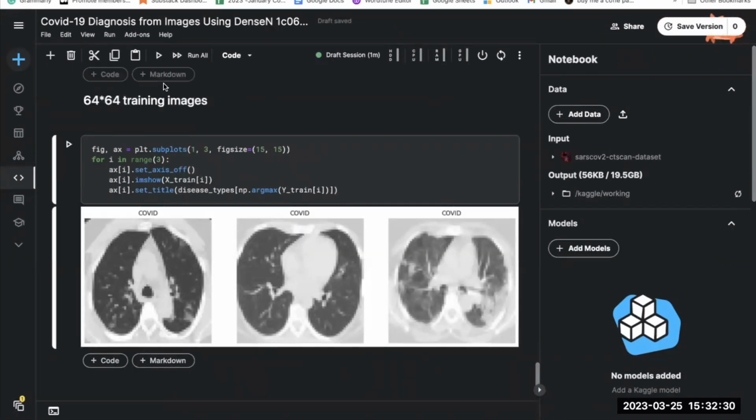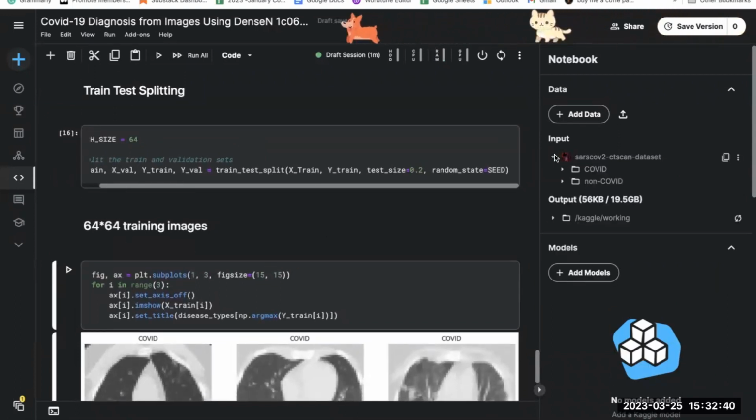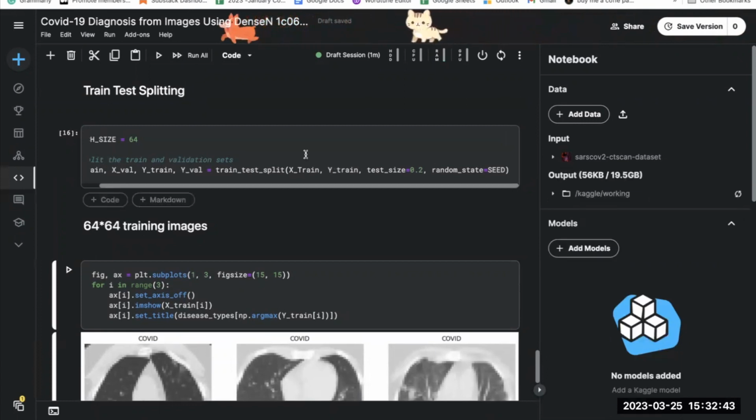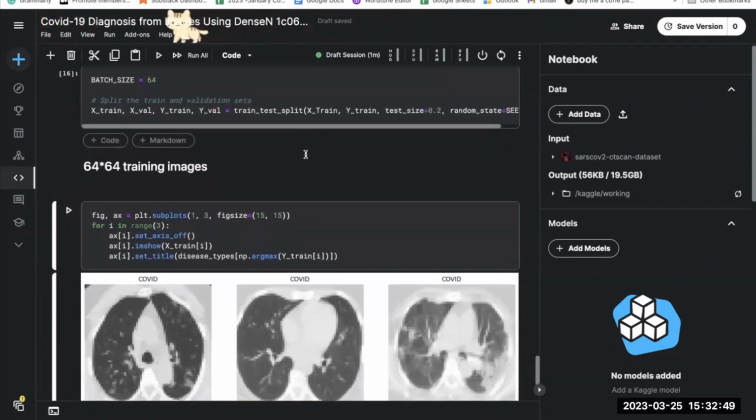There was some error with disease type. As I stopped the notebook, something changed in the data set. I changed it and I didn't update it in the notebook. That's why there was that error. Now that it is fixed, we can move on.